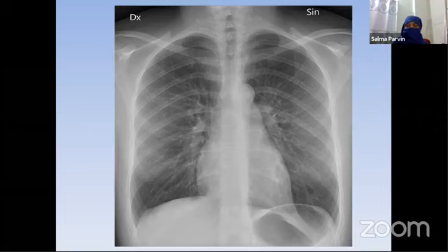I think this is very difficult for a patient to stand in this way, and to get such a properly positioned film is not very simple. This is a very much calculated study, and it needs so much technical application from the patient's side and also the technologist's side.